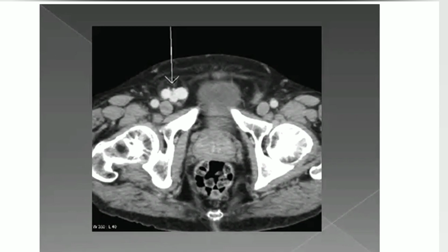So we are dealing with a unilateral right-sided varicocele, which is rare or less common. That's why we have to exclude any retroperitoneal malignancy. We have to exclude any compression on the renal vein, renal vein thrombosis, retroperitoneal malignancy or splenorenal shunting.